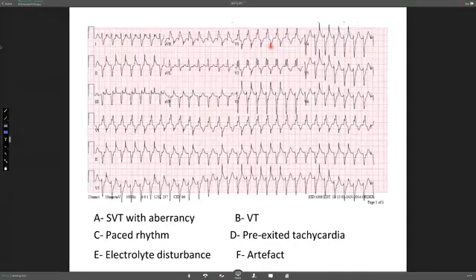You could see it in V1, even though this is negative, and in V6 you could see it on the top of the T wave. So it's probably a limitation of the algorithm for the ECG recording machine. So I agree with you. Fathi, go ahead with your comments.